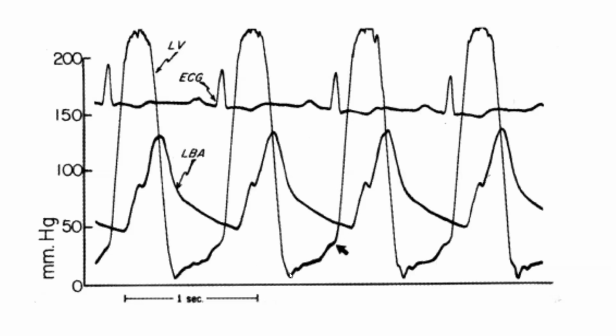Now analyze diastole. In diastole, you have a very low diastolic pressure, less than 50 millimeters of mercury, and you have a high LV-EDP of about 40 millimeters of mercury. So aortic and LV end-diastolic pressure nearly meet. And the aortic pulse pressure is relatively wide. Actually, the pulse pressure is way more than half the systolic pressure. So we definitely have a suggestion of severe AI. So you have severe AI and severe AS.